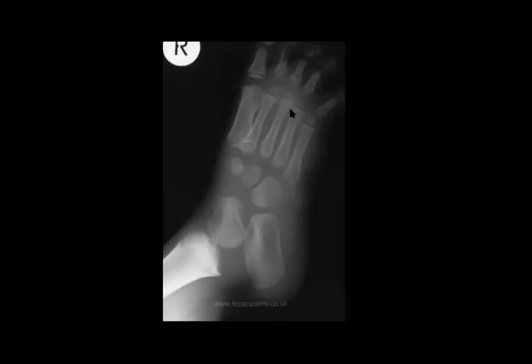Okay, so the question will be if this is the tibia, right? Are you happy with this appearance? Maybe something normal, but the question will be where is the fibula? So what is the abnormality now? Absent fibula. Perfect, yeah. So there is fibular aplasia, right? You agree with this? Yes. Perfect.